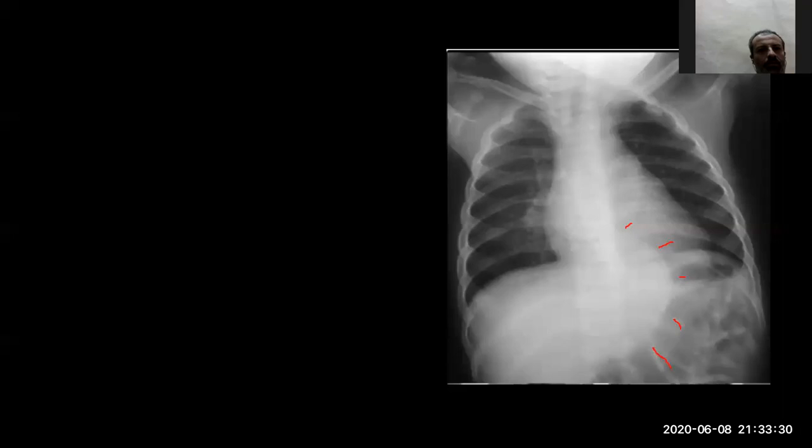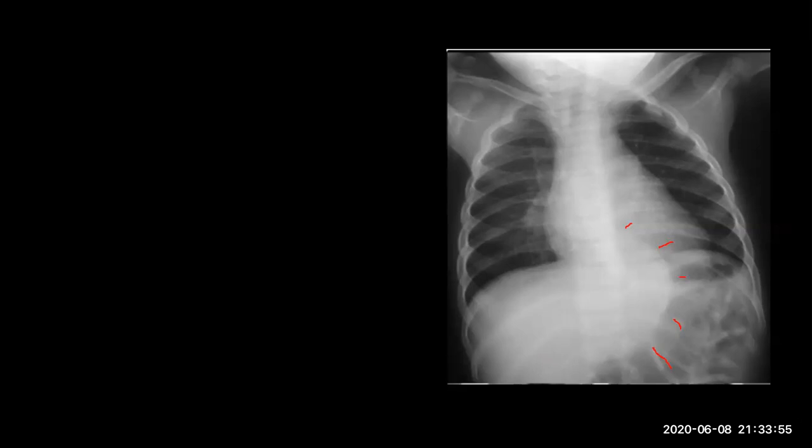Doctor, maybe aortic aneurysm? This is a child. Scimitar? This is a child. Wait, don't jump. Don't jump. Okay, I will help you. This mass is oval in shape, as seen on the chest X-ray. That mass is seen through the diaphragm, and we see that mass.